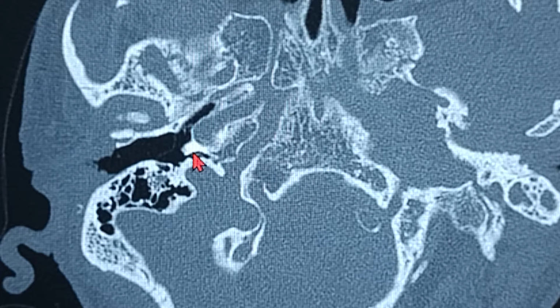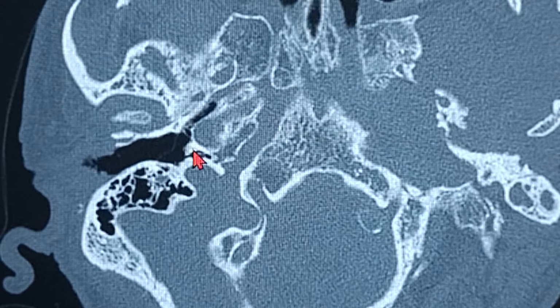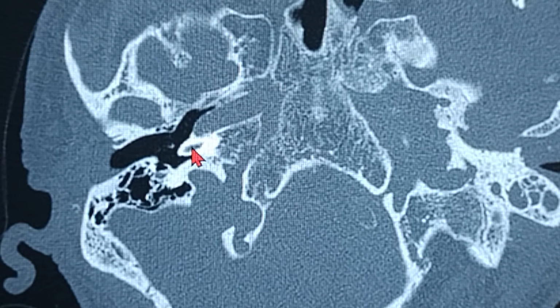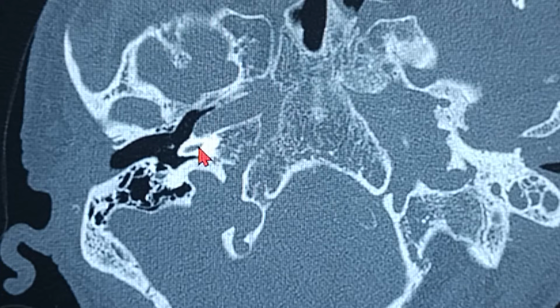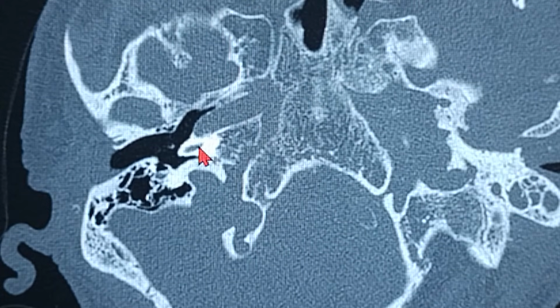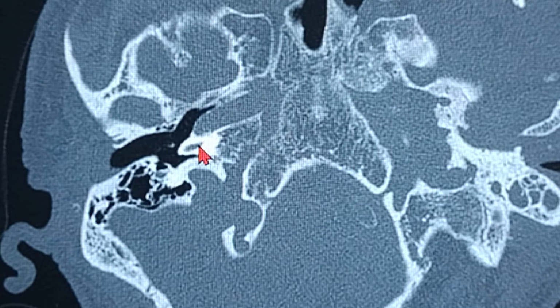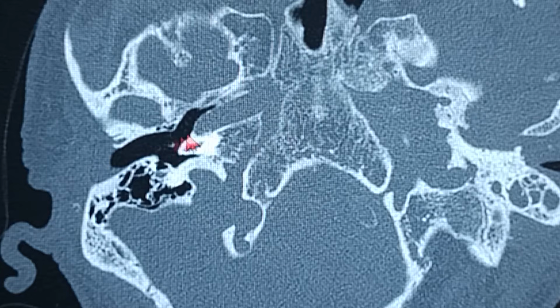That bone represents the middle ear. Now this bone is basically the promontory in the middle ear. So when you open up during tympanoplasties and MRMs, when you lift up the annulus, you see a huge bulge in the middle ear, right? That's the promontory. You can see that's the EAC, that's the tympanic membrane area.